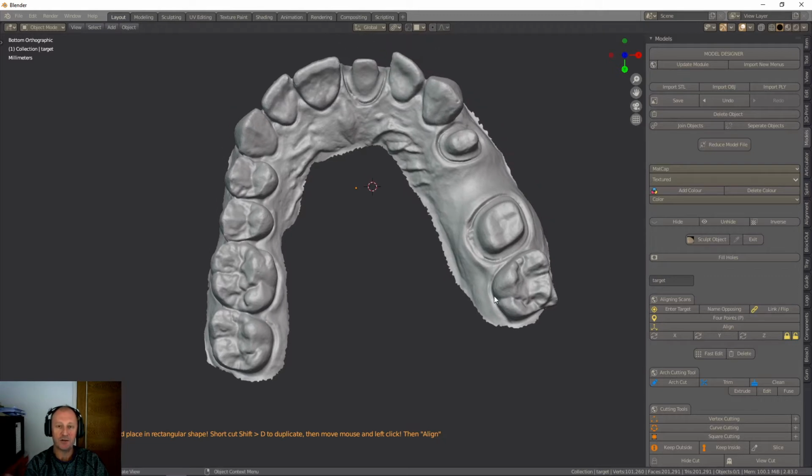Now what this does is it automatically puts the model up in a position where we can put those 4 points down that we did last time. This model is a lot nicer. All the teeth are in the right place, so it aligns a lot better than the last model we did. But the principle is all still the same. We're going to align, and put 4 points down in a trapezoid fashion like we did last time.